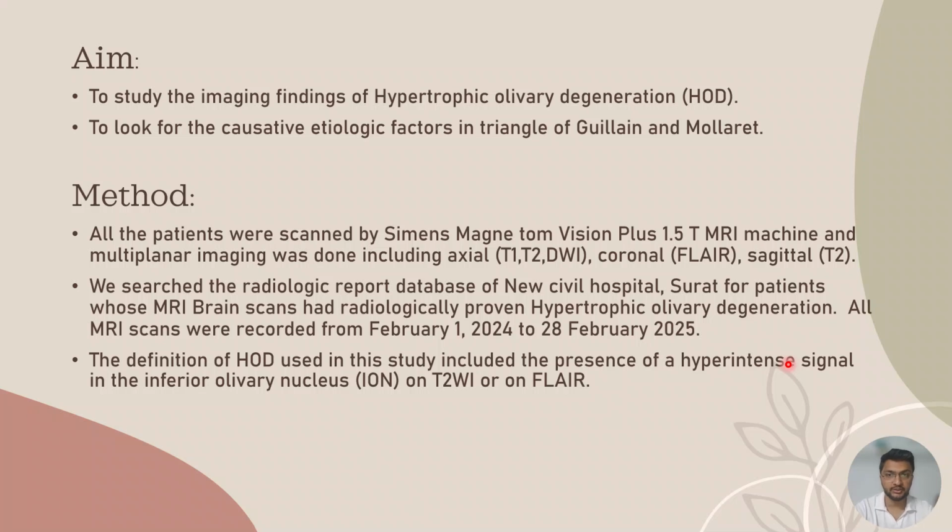The aim of my paper is to study the imaging findings of hypertrophic olivary degeneration and to look for the causative etiologic factors in the triangle of Guillain and Mollaret.